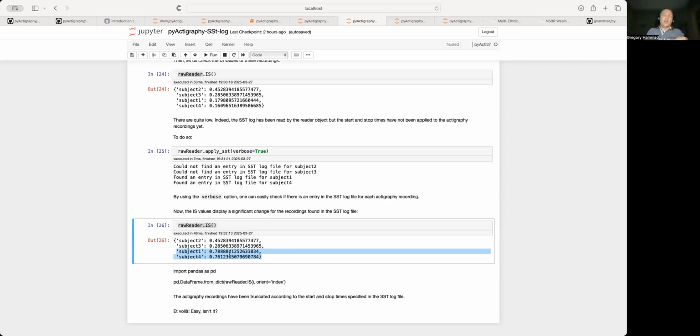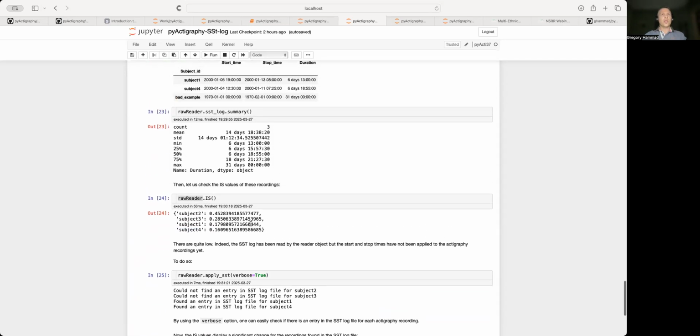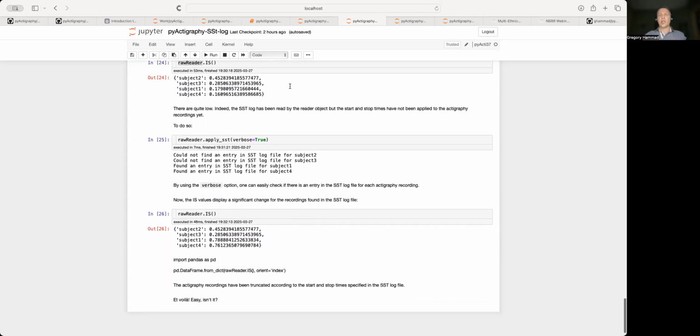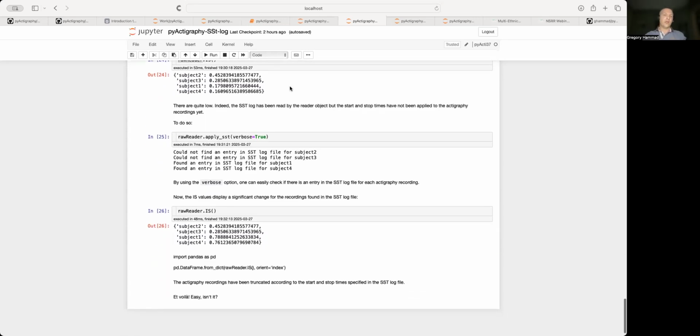It is annoying by definition because you have to inspect, you have to type the start and the stop. But we tried our best to provide tools so that once it is done, you can reuse this information, you can actually share this information because it's contained in a companion file, and then someone else can continue. Maybe you can split the data set in two and do the first half. A colleague will clean also the second half, or you can even share within the team. You see, it might be a collaborative effort, which makes it easier.